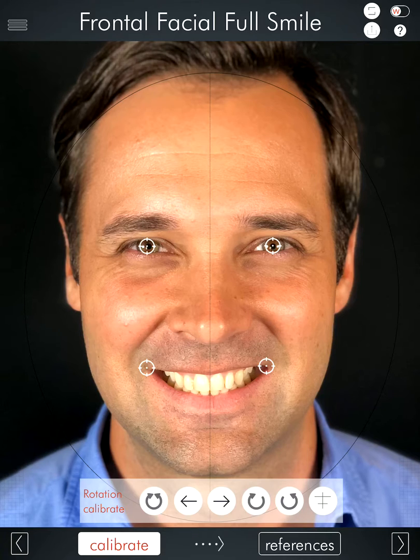And as you can see, we have now opened the case and started our Smile Simulation. Please refer to the Smile Simulation video for a tutorial on how to perform a correct Smile Simulation.